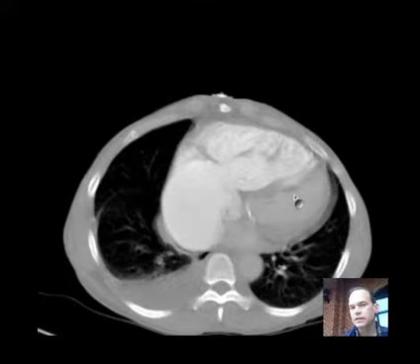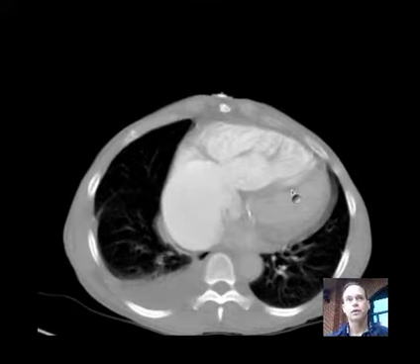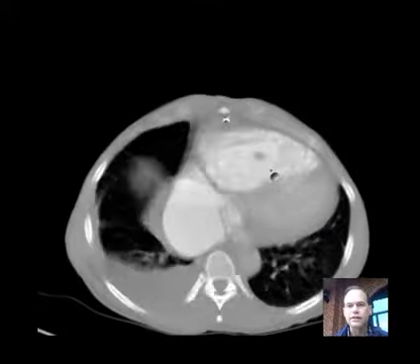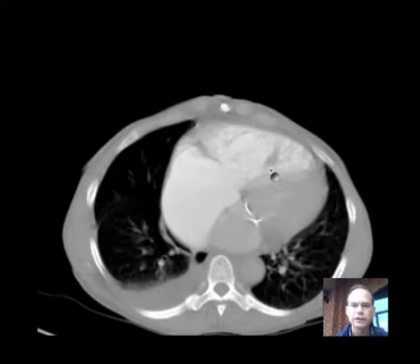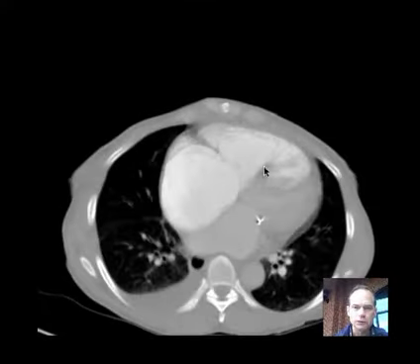Now this is something that we usually see in another diagnosis, in another situation. What might that be that would cause increased pressure and an inability of the right heart to empty fully? It's pulmonary embolism, because this right side of the heart, of course, is emptying out superiorly. Remember, the pulmonary artery comes off in the front here, and it empties out into the main pulmonary artery, right and left.